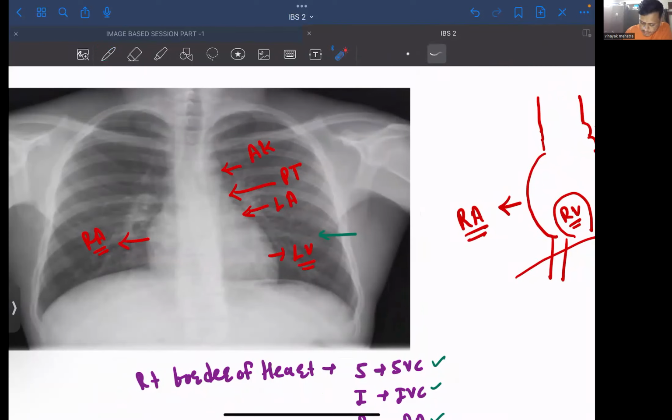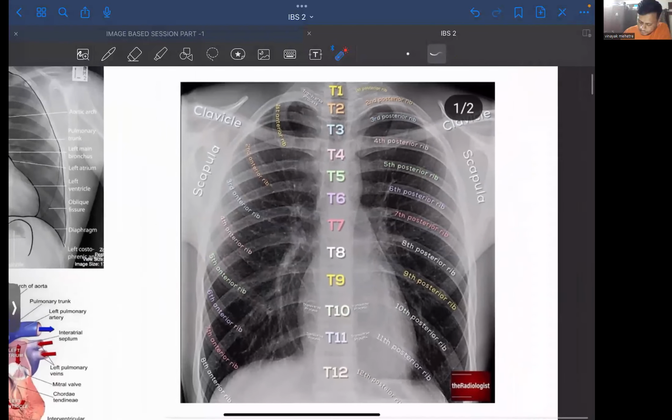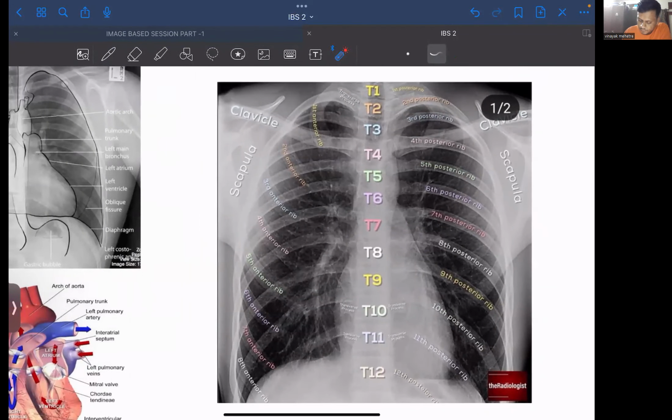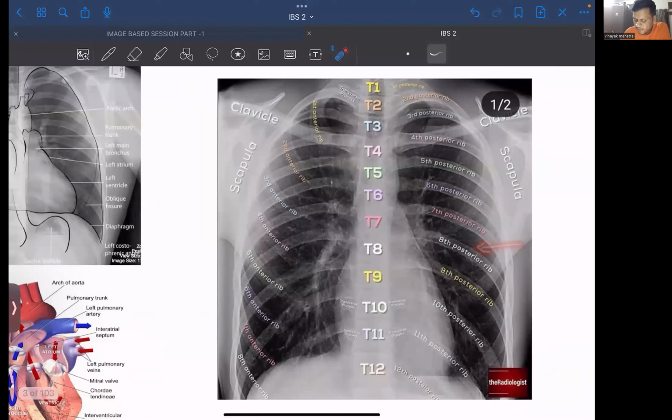Actually, this is not the rib which you are seeing. They have asked you the rib which is in the back. Right? It comes from the back to the front. So they are actually asking about this rib. Take a look over here. How did the fourth rib go? Like this. So if I mark which is this rib, then you have to answer which rib?